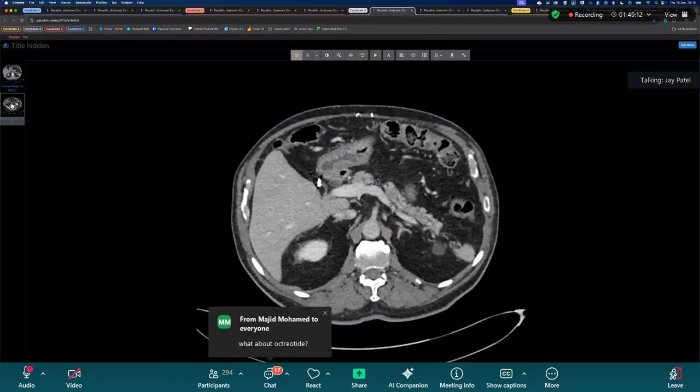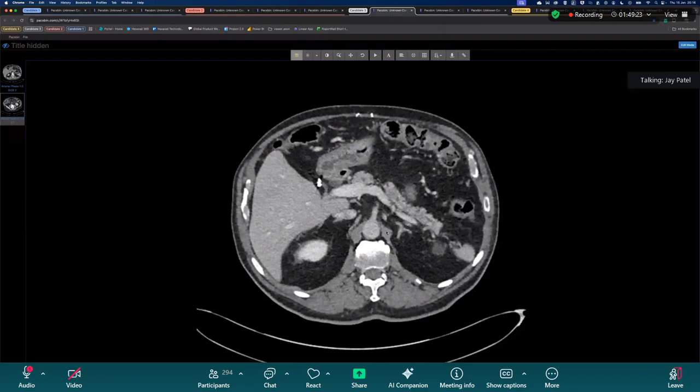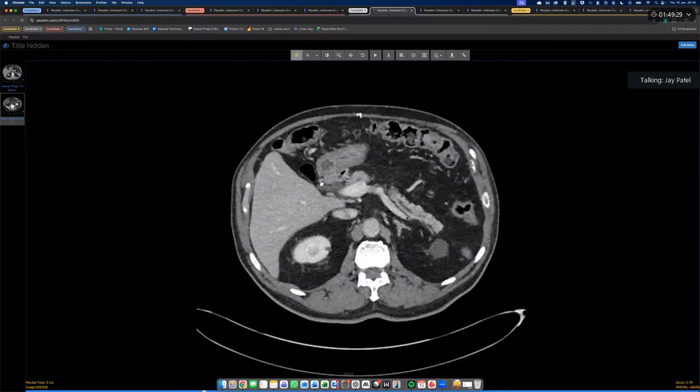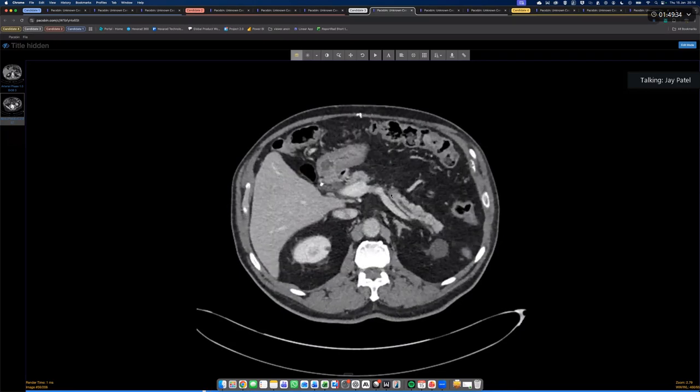And this is one of the things I would say, right? This is a typical presentation of a typical thing, but it's an important thing. And these pancreatic cancers can be subtle. So what makes me think that there's a pancreatic tumor here? The one and only thing that makes me look at that abnormality more than anything else is this duct.